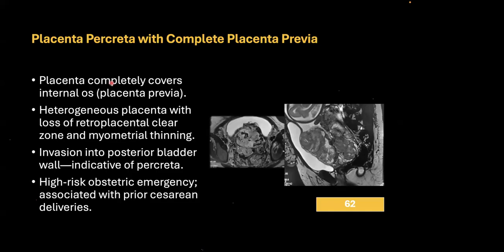Choriocarcinoma? Why are you calling it choriocarcinoma? Well, this is a plain scan, I could not show you the vascularity also. So you have to look for it in a contrast scan, invasive and aggressive. So we can think of it, but we require a contrast scan for that.